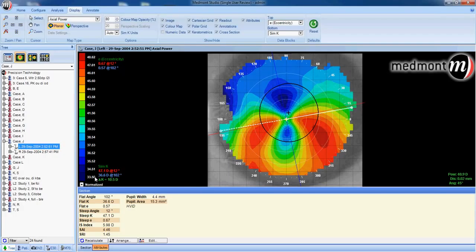We could also look at the scale range, and we go from 33 diopters on the flattest we can read to 48 diopters, the steepest the topographer can read, a scale range of 15 diopters. Normal corneas fall within 10 diopters, so this is an abnormal eye. We could look at the IS value, and corneas with inferior corneas steeper than 1.5, or in other words, if the IS value is greater than 1.5, that's indicative of a diseased or asymmetrical eye.